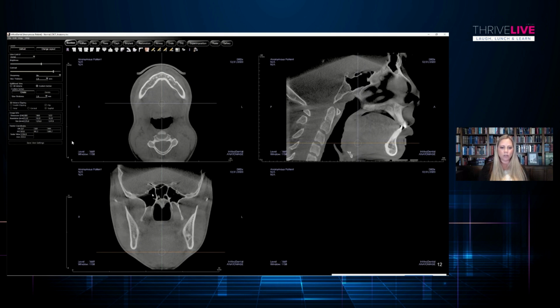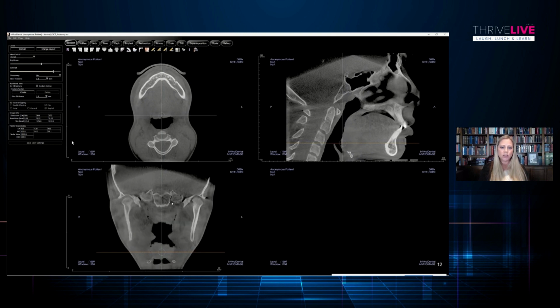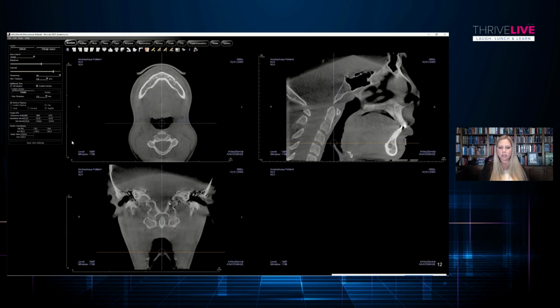We can see foramen rotundum, some of our other foramina as we extend through. We're going to see foramen ovale as well. So a lot of great foramina within that sphenoid bone. Sometimes we'll see calcifications superolateral to the sphenoid bone as well. So we might have internal carotid calcifications. We can definitely see the internal carotid as it kind of turns and looks like it heads south.